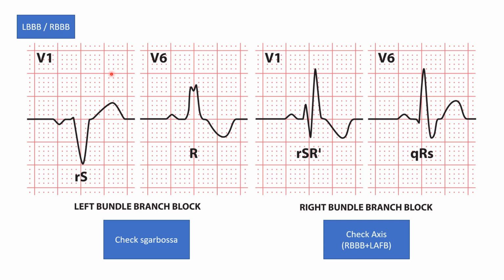Okay, then you have left bundle branch block, which is usually this is left and this is right, and the mnemonic is you look at V1 and V6. In V1, if you have a big fat V, that's what you think of then. Be aware that this is not a Q wave, and sometimes you can be tricked, but there's a tiny R here. Sometimes you may have Q waves that are big and narrow that look very much like this.